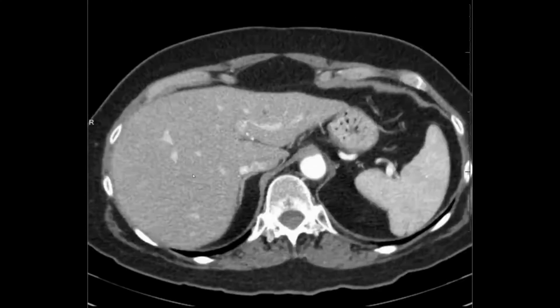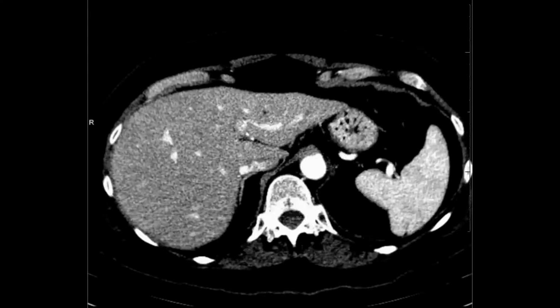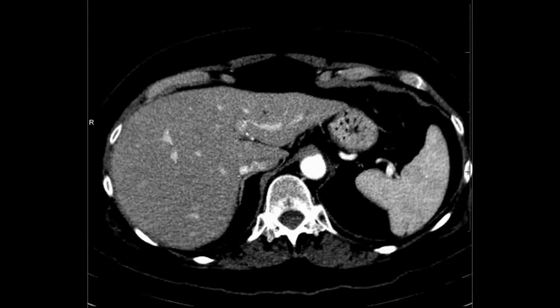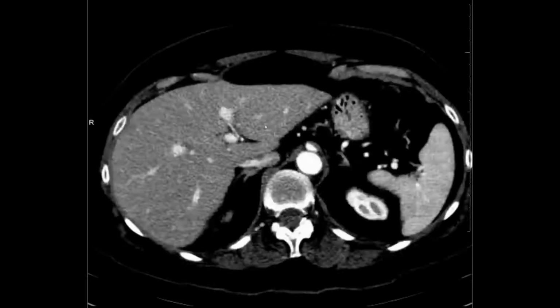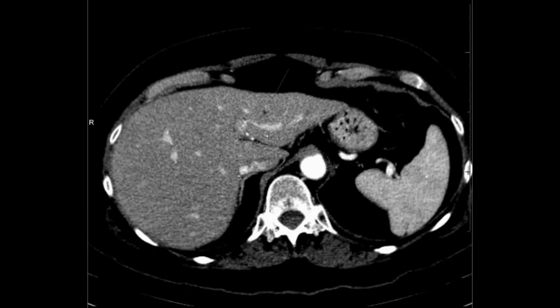And then quickly view. And again, the liver windows help make anything really big stand out. And so in this case, I see a little ditzel right there in segment 2 that's kind of non-specific. Can't really tell you. I would say in this case, too small to characterize, but still report it.